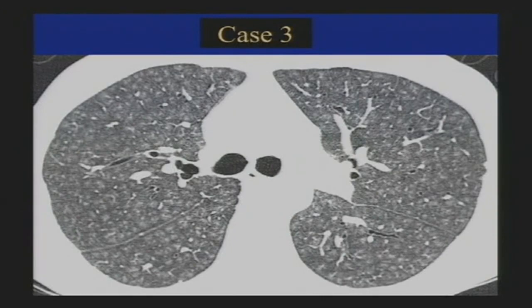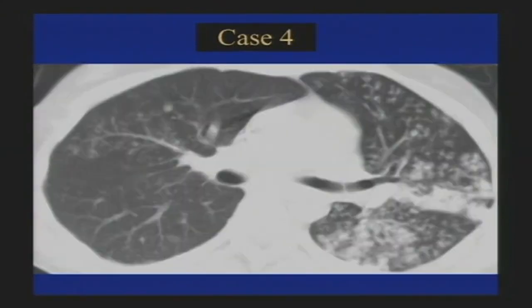So Rick talked a little bit about nodules, and we'll go over a little bit more about nodules in the context of airways disease. Here's another example. I think a lot of chest radiology is knowing when to be definitive about one particular disease or organism and knowing when to give a differential. In a case such as this, you don't need to give much of a differential because there's a very, very specific finding here that will narrow it down to a very small group of diseases that could cause the abnormalities.